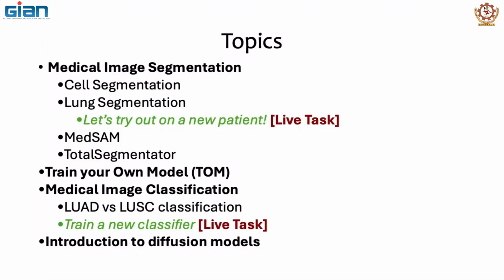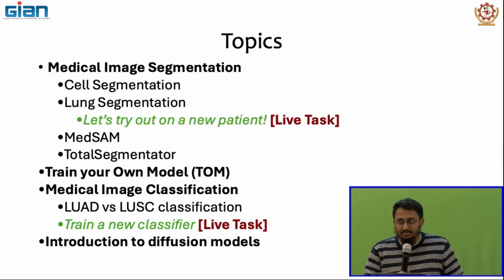So in today's session, mostly we'll be covering medical image segmentation. You all have downloaded the 3D Slicer software and all the images. Very good. So we'll look at cell segmentation, lung segmentation, and you will get to try it out on patient data yourself using the code that is being provided to you.